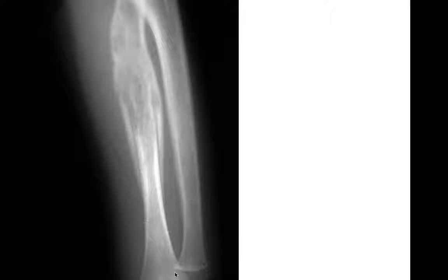All right, this was a child in this case. We see there's this geographic lytic lesion with a wide zone of transition right here, and around the lesion we see this solid heaped up periosteal reaction. The periosteal reaction is fairly non-aggressive appearing, even though the lesion itself, because of the wide zone of transition, looks a little scarier. So I think it's reasonable to consider more infiltrating processes such as a lymphoma or an Ewing sarcoma or infection. This case turned out to be a Langerhans cell histiocytosis, or EG, in the bone, but a less aggressive, solid periosteal reaction appearance.